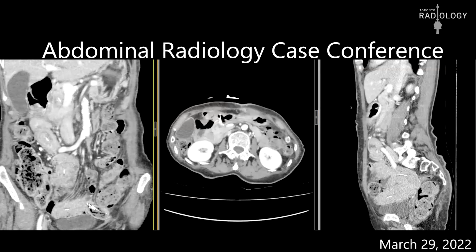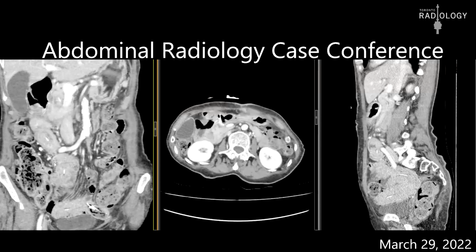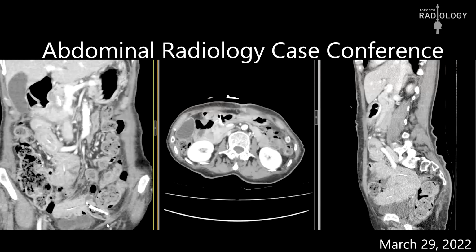But now the question is, why would the bowel get pulled up a tube? Because we place tubes all the time, and we don't ever find the tube distally migrating when it's proximally fixed, or the bowel being scrunched up like this. That makes not much sense at all.